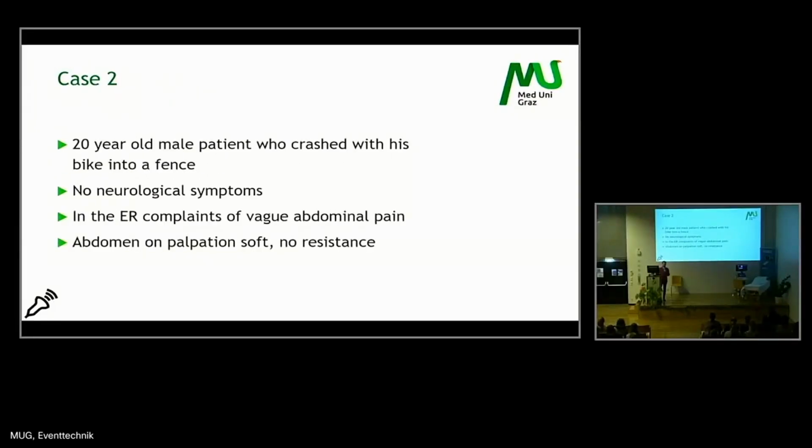Why I'm showing you that is because a lot of the cases are negative eFAST cases, so you should be confident about seeing something that is normal and something that is not there, like when there is no free fluid. So get a hold on the normal anatomy and feel confident with negative eFASTs.